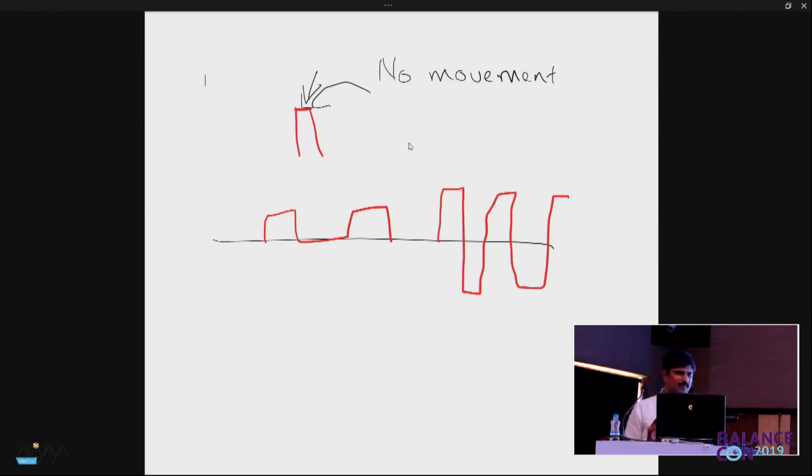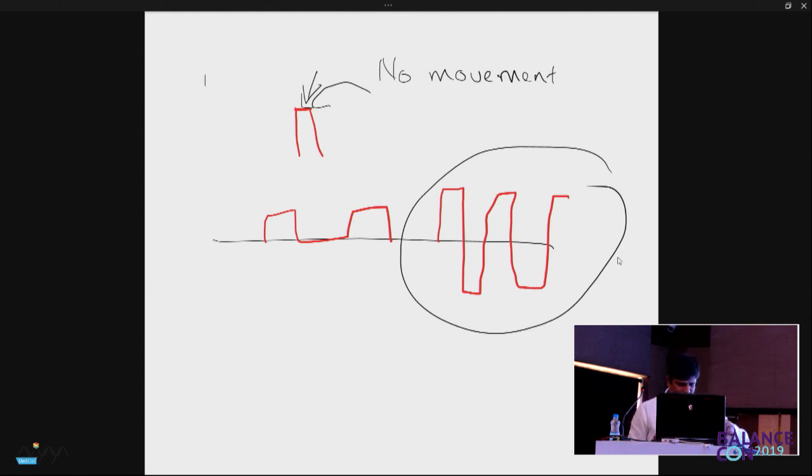So this is typical. This is there in square wave jerks, micro square wave jerks, and also in the macrosaccadic oscillations that we saw. We know the difference between a jerk, only one side, and an oscillation which goes to both sides. Now, coming to the next one.